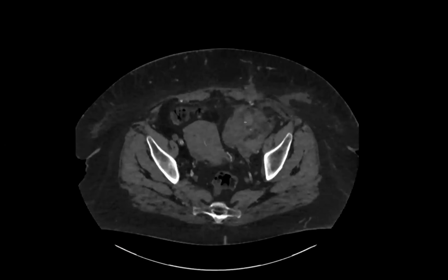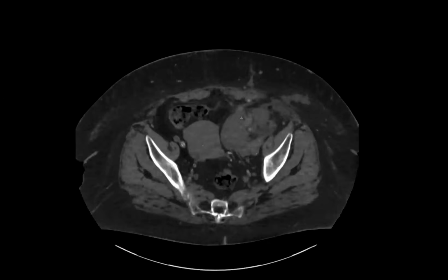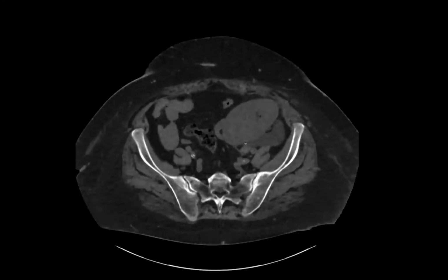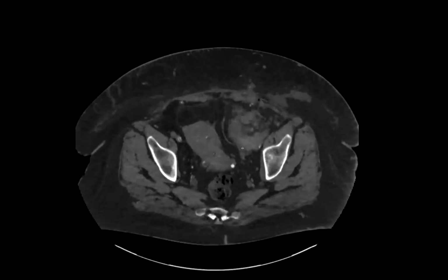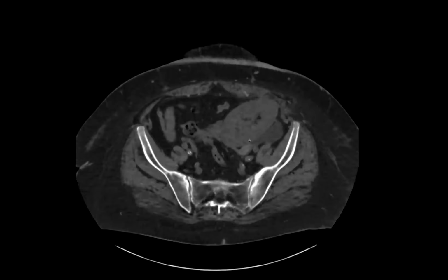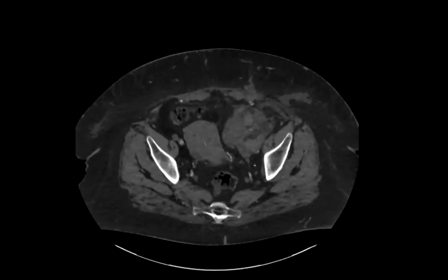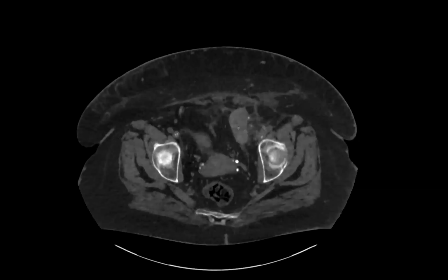And so the vein is here. And they actually did an extension. So I think they took the donor IVC or iliac vein and then did an extension because they didn't have enough length. And so here it is. So acute hyperattenuating thrombus. Yes, expansile, and it's hyperdense on the virtual non-contrast.